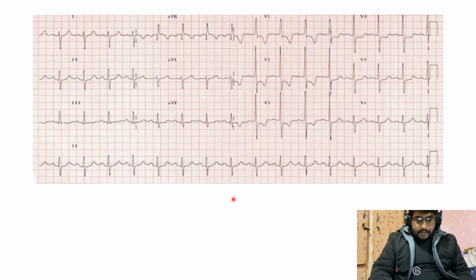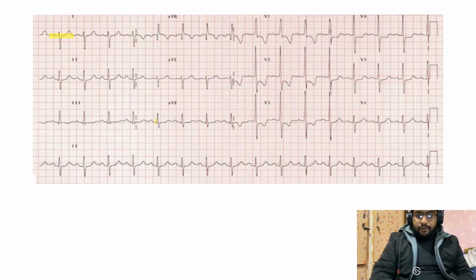All right. So if we look at here in V1, let me just get the highlighter. Okay. Lead 1 is pointed more towards the downside, right? And aVF is pointed more towards upside. So it means this is right axis deviation. And here you see the actual picture in V1 and V2. Should you be seeing this R wave so dominant there? No, you shouldn't. And it means that there is right ventricular hypertrophy right there.